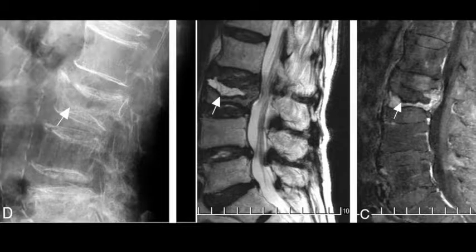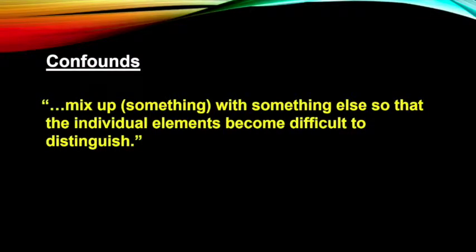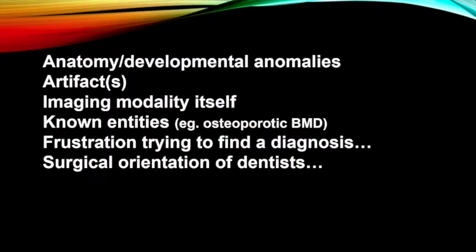You could, but you can see the different weighted signals. This is a vertebral body with some destruction in the middle of it, bright signal. This is fat suppressed or T2 signal, and you get the fat and the edema coming out in there. So now, there are confounds. Don't worry, I'm getting to some images, I promise.